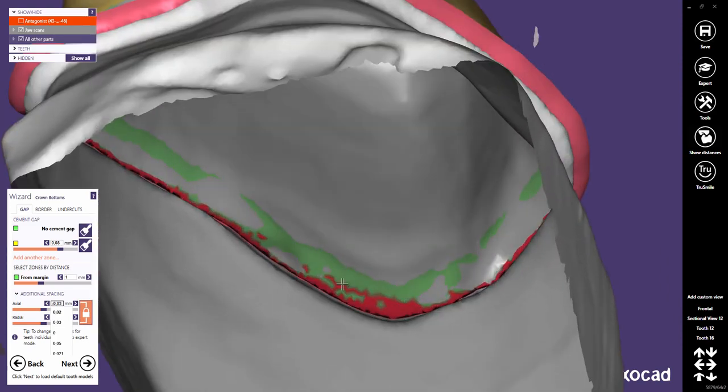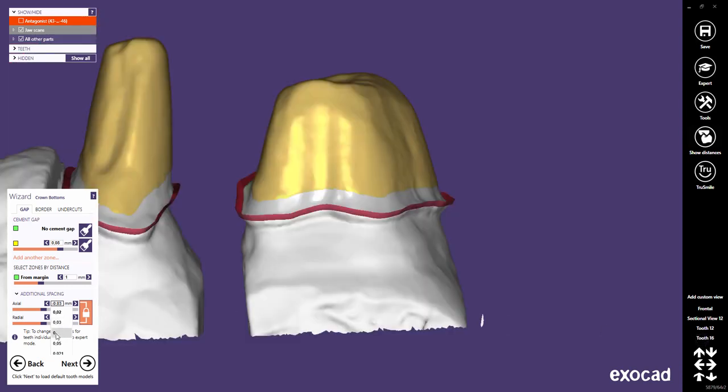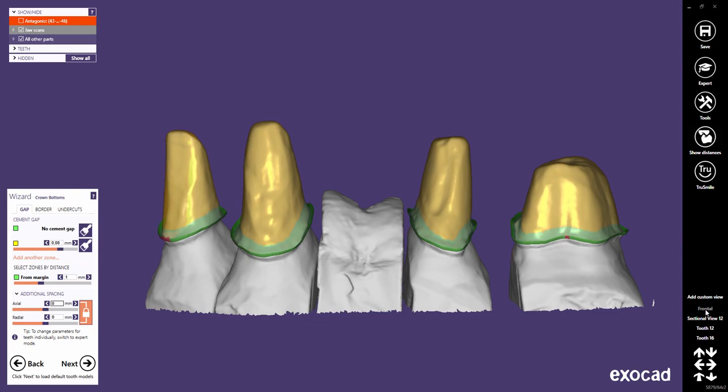However, trying to improve the fitting by changing the additional spacing values is a workaround, not a solution. A properly tuned cam system should be able to achieve good fittings with minimal additional spacing.